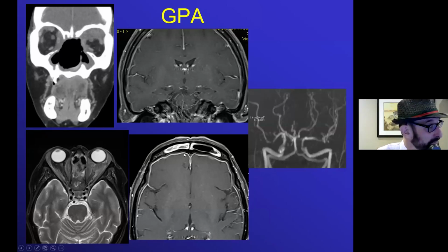However, as I mentioned, the meningeal involvement is one of the more common of the central nervous system involvement, more so than what we see with regard to the vasculitis. But nonetheless, this patient was one that did show manifestations in the middle cerebral artery distribution of the vasculitis.